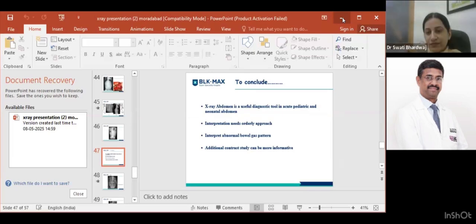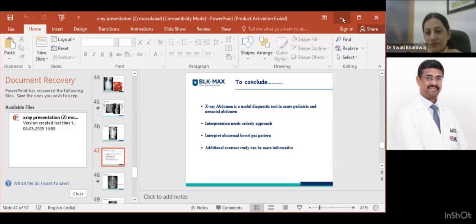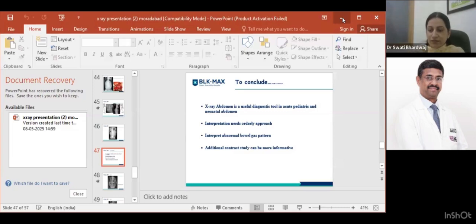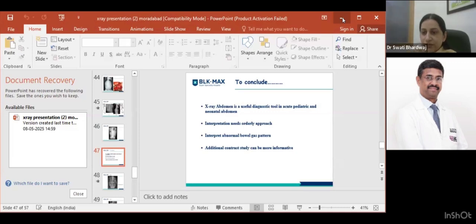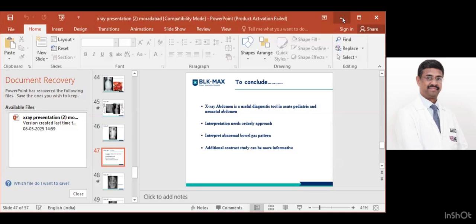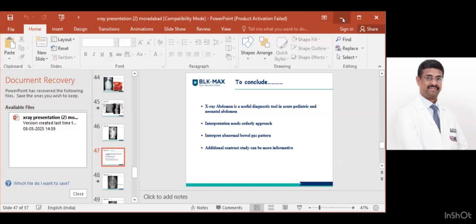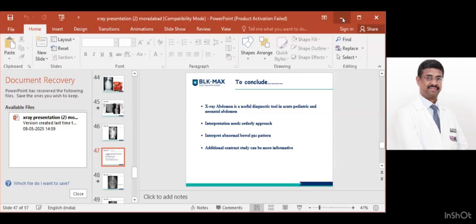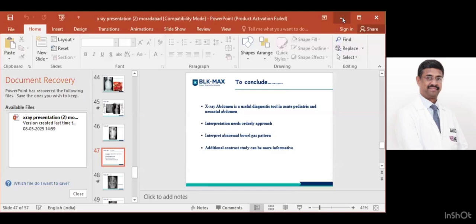And the one point that I would like to comment upon is gas in the liver and the portal vein. I think this is a very, very important slide. People should be sensitized to it, because your eyes see what your brain knows. The gas may be staring at your face, but your attention will not go there to interpret it as a severe condition which could point towards a very important diagnosis. That was a good slide, and I think people should go back to the slide and have a look.